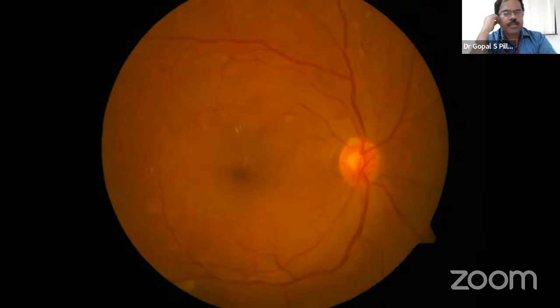Okay, can we go to the next slide, please? And one more thing, from what Dr. Talwar had said, we have a treatment entity called focal macular laser in center involving diabetic macular edema. Currently the classification of diabetic macular edema itself has changed into center involving and non-center involving after the advent of OCT. What we were doing without an OCT was what Dr. Sir had told, the 3 criteria for clinically significant macular edema.